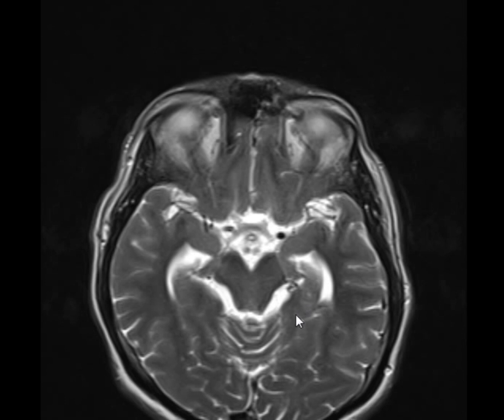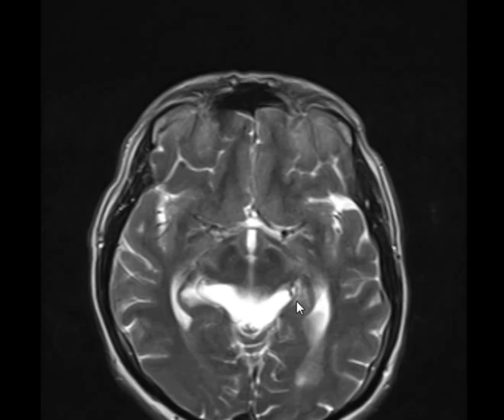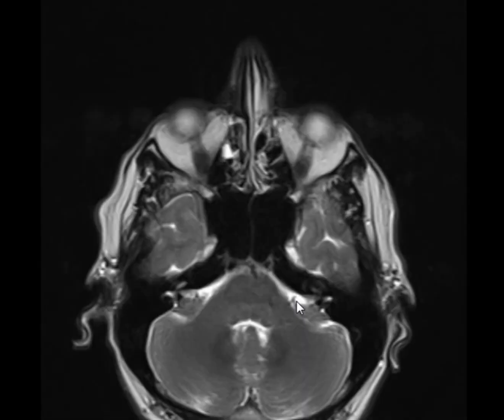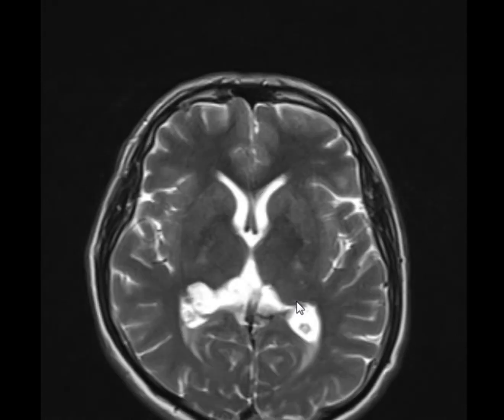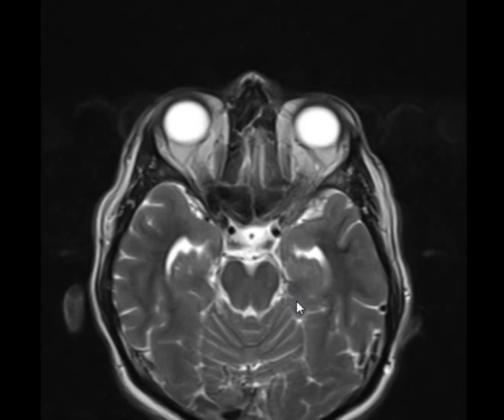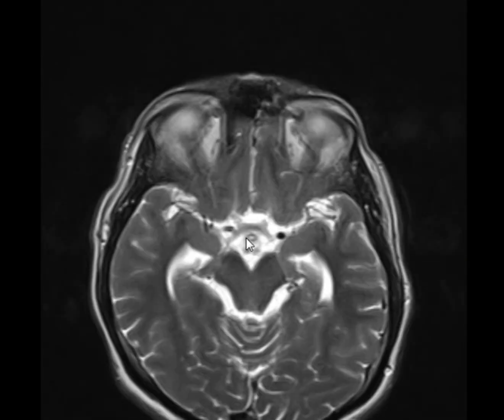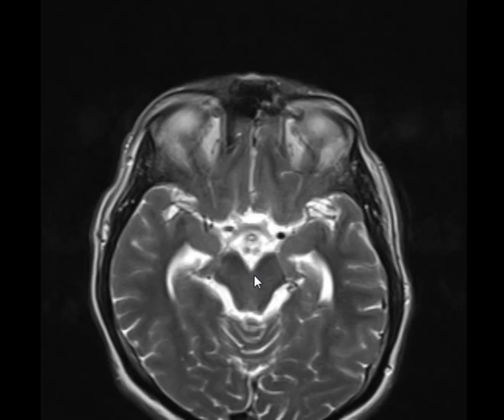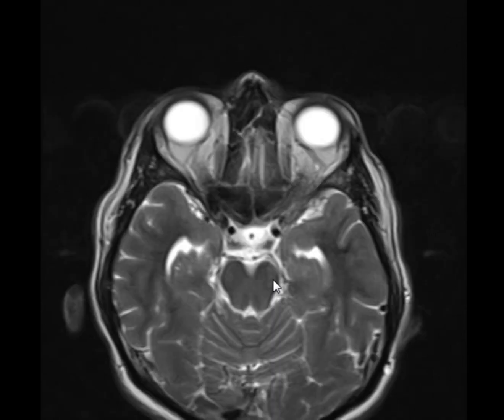By the way, it's big. Big, not a spot. And please keep quiet. Let your friend focus. Yes. And midbrain looks okay. Midbrain is normal. Yes, hippocampus and medial temporal lobe look normal. Good.